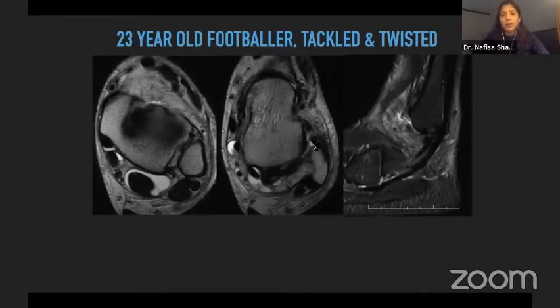And we always want to tell the surgeon exactly how the tear is, what is the thickness of the tear, what is the edema in that region. Whether this patient will be put to conservative treatment or not is the surgeon's call. Most patients do well with conservative treatment. And when we have an ATFL tear, we also want to look at a CFL tear in that case.